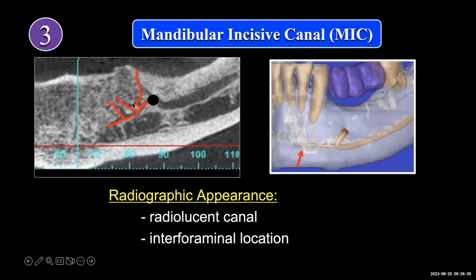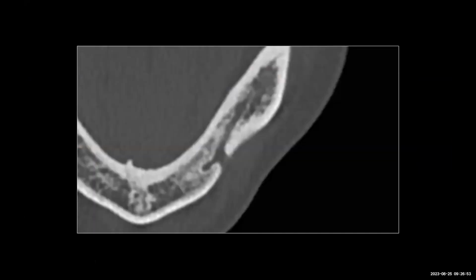Now, it can be extremely variable. You can have these radiolucent areas go all the way up to the ridge, or they can just be like this. It all depends on when the teeth were taken out and how fast those are necrosing and become necrotic. So if we look, this is an axial CBCT scan. So this is the mandibular canal, inferior alveolar canal. This is actually the incisive vessels, and then this is the mental vessels. So these two travel, they coincide with each other.